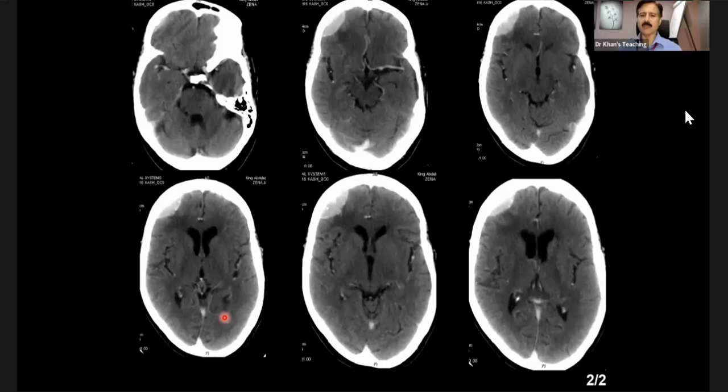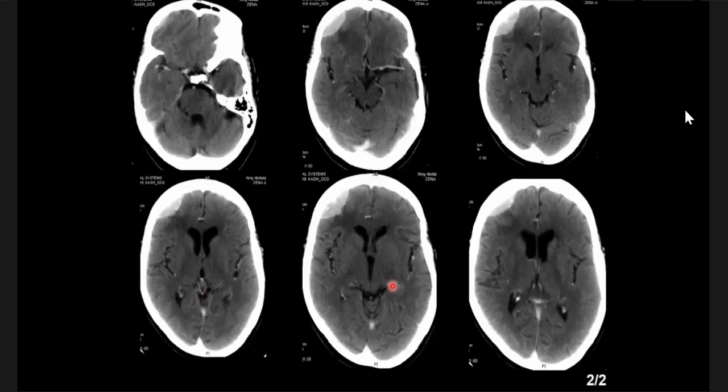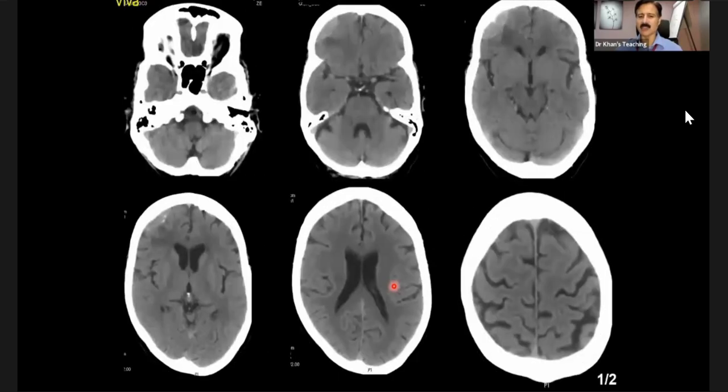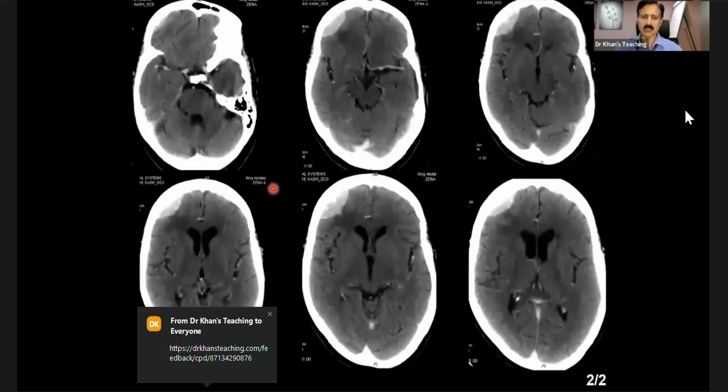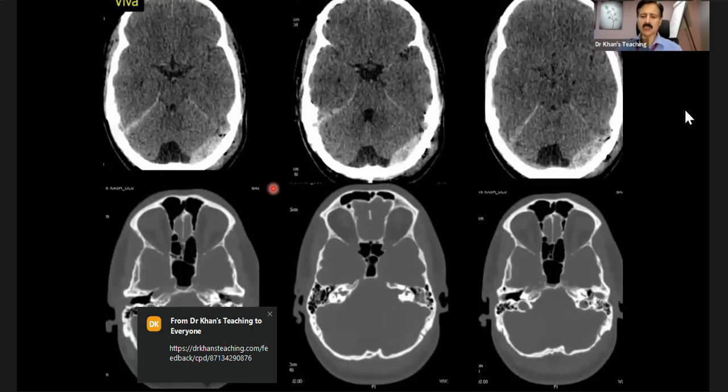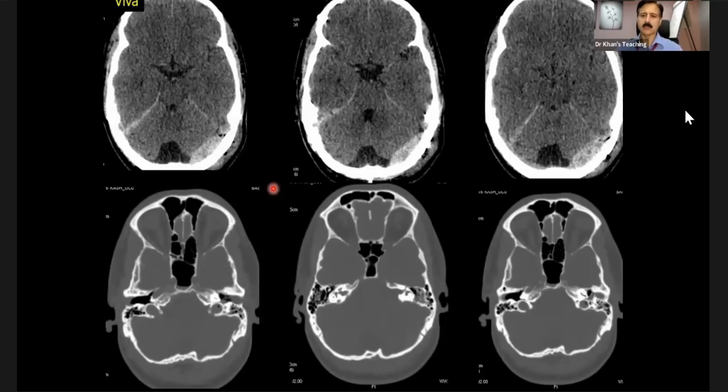Have you noticed that I've shown you the next meningiomas, maybe an en plaque kind of meningioma. This is a meningioma. That was a trick case, which can come up in the exam. This is a classical trick case where you assume things. And by the way, this is what happened in this case. This presented with a history of trauma. The key thing is that this is a meningioma with calcifications. You start thinking, why calcification? Give contrast. And this is a meningioma. Okay? This is your last case, and candidate 7 should be ready then.